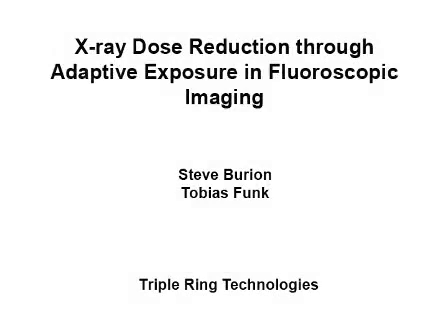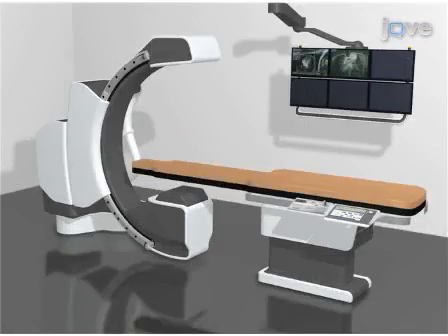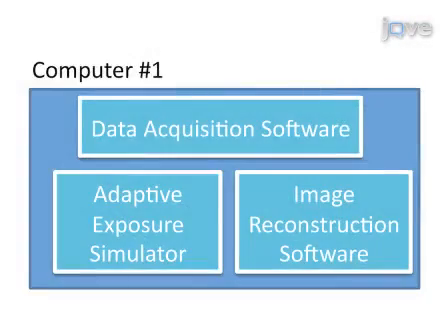This experiment shows how to use the scanning beam digital X-ray system to save dose by locally adapting the exposure to the opacity of the object, rather than exposing it uniformly as done conventionally. The first step is to acquire a first-pass reference image and define the parameters of the adaptive exposure algorithm system.